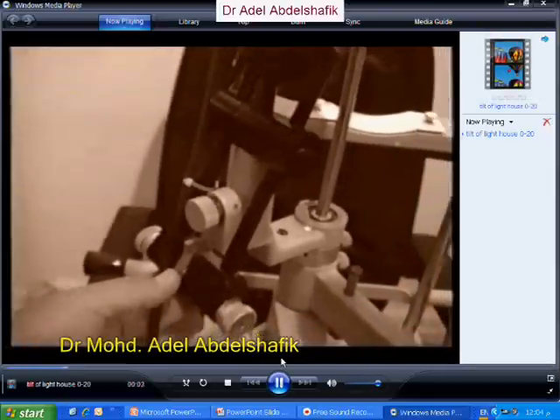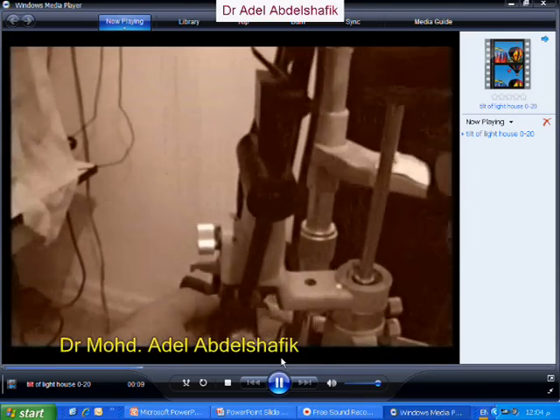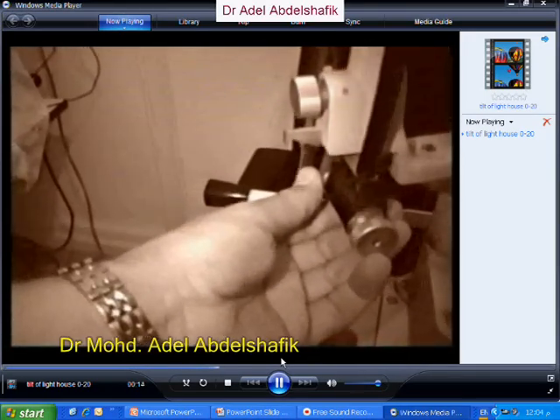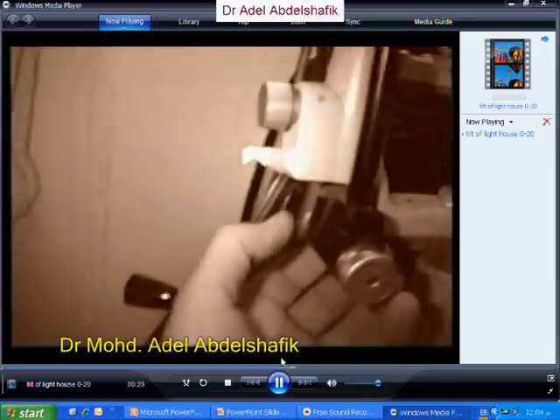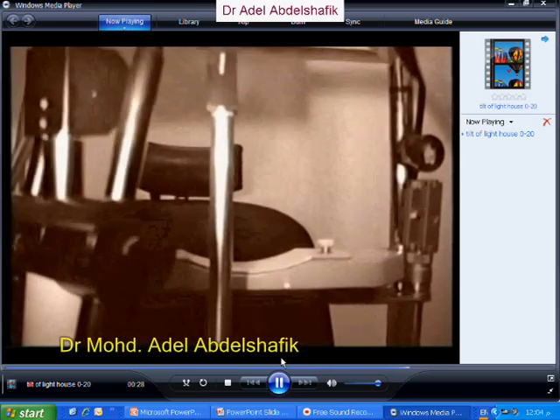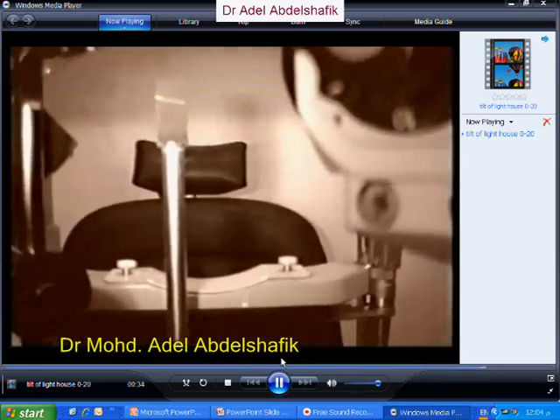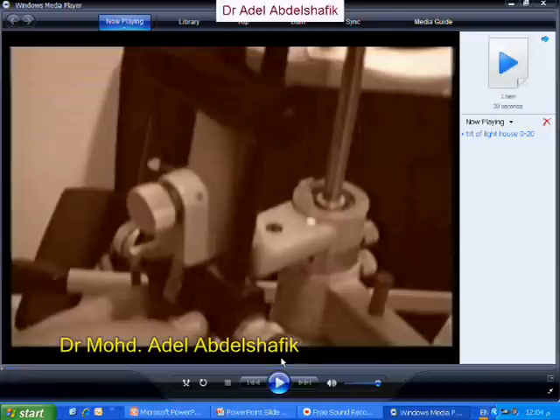You see these steps behind? We can tilt the whole column of the slit lamp. This is totally vertical and this is angulated. Each step is angulated 5 degrees. So if I have a horizontal beam and I make this tilt, then the beam will come with 5 degrees to the horizontal line, or 10 degrees to the horizontal line. So this is the idea of having this inclination of the slit, just to make the light not horizontal but coming from up, say 5 degrees or 10 degrees and so on.